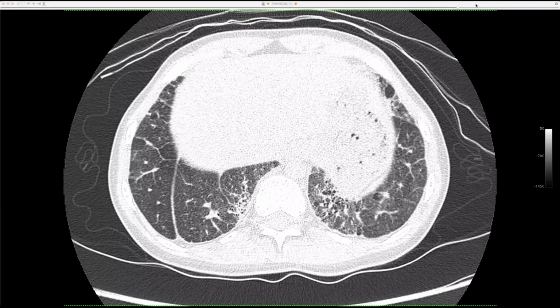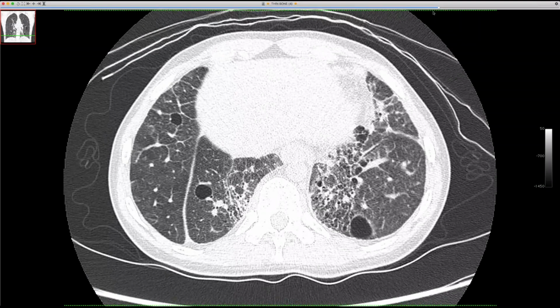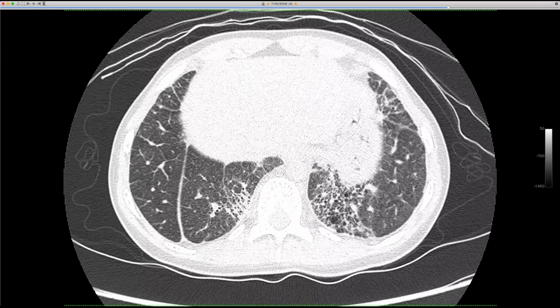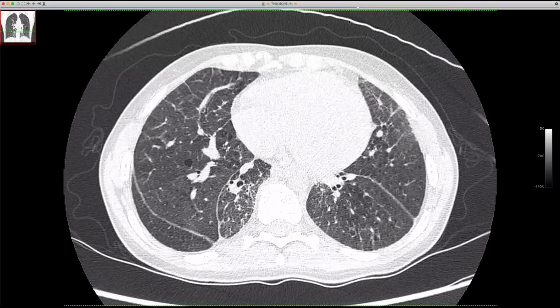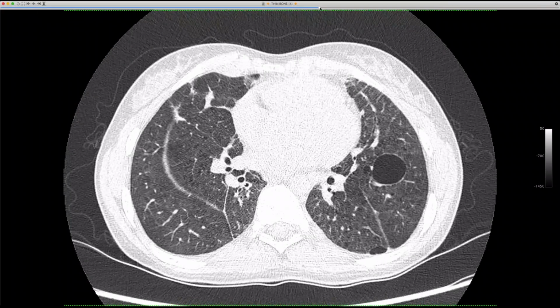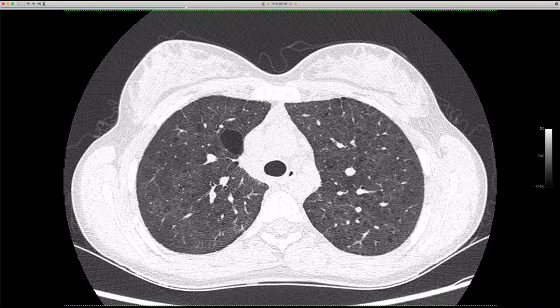So when I was asked about this case, I think she's got a couple things going on. And kids with diffuse lung disease, their scans look very strange. But considering she has effectively a connective tissue disease, I think this is sort of an NSIP-like appearance that's been long-standing and slowly progressing. I think we can ascribe the cysts to an LIP-like picture. I don't have tissue confirmation on it, but they really look LIP-like, perivascular, thin-walled, not a lot of them, somewhat heterogeneous. And then I don't know what to make of this emphysema, other than if it is emphysema, but it sure looks like centrilobular emphysema, and whether that's just related to connective tissue disease or not. I don't know if anyone else has ever encountered this in a young patient who's had long-standing lung disease.